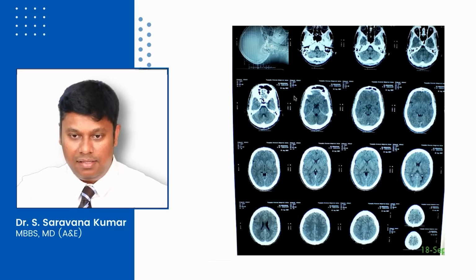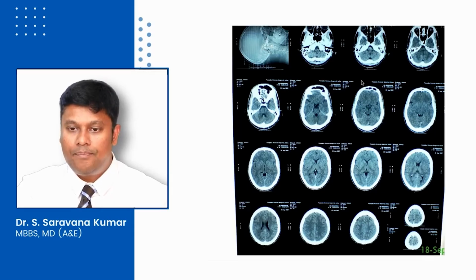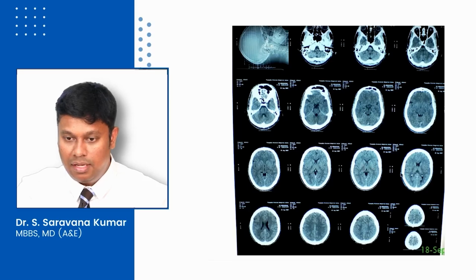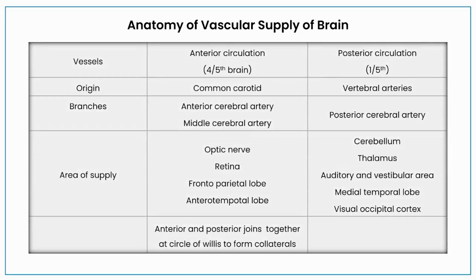So let's quickly revise. You have the thickness of the slice, medulla, pons, midbrain, quadrigeminal cistern or smiling cisterns here. You could see third ventricle, internal capsule, thalamus, lentiform nucleus, the lateral ventricle, the body of lateral ventricle, choroid plexus and cerebrum proper. Very easy, isn't it?